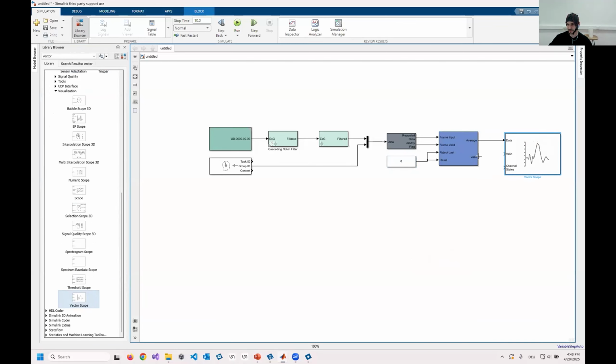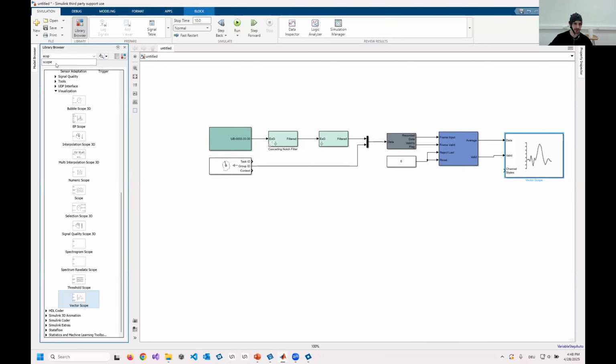All right, it was a quick run of how to set up an event-related potential pipeline. Maybe to sum it up shortly, we have the remote acquisition, which is acquiring data from the recorder. We have the paradigm presenter, which is presenting stimuli and triggers. We pre-process EEG and align it with the trigger. And we're triggering the data to actual timeframes, and we're averaging a lot of them together so we can actually see data. And I also want to visualize the EEG, so I can be sure that the data is good.